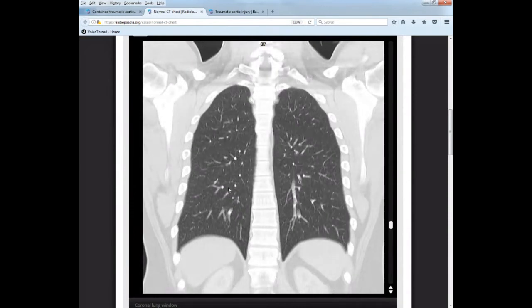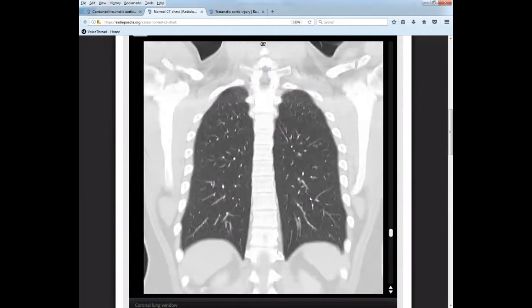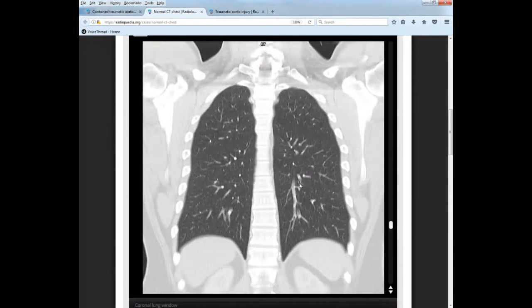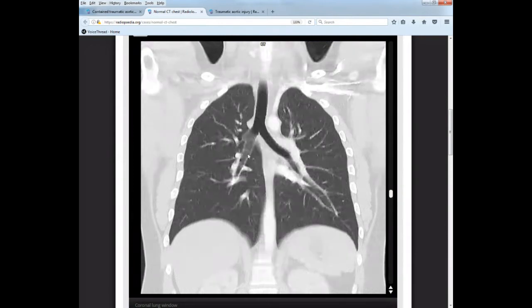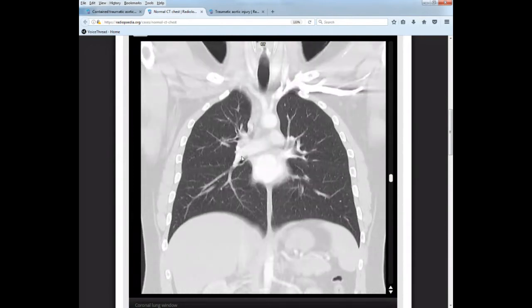It's going to get harder and harder the smaller you get, obviously. Here's a branch right here. But these circular branches that have the dark spot in the center are the branches of your bronchi. So remember, your bronchi are main stem, secondary or lobar, tertiary, all the way down to the alveolar level where we have gas exchange taking place.